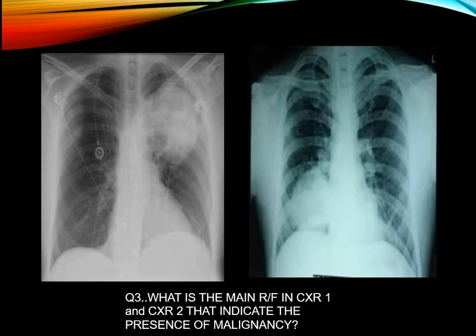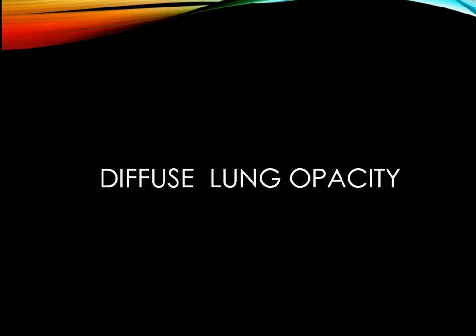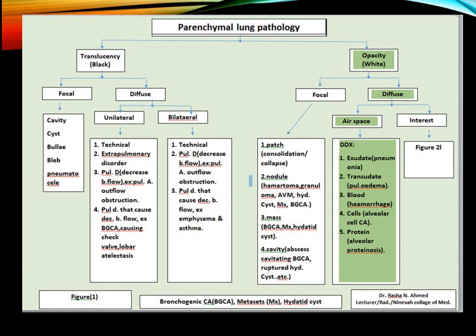The X-ray, I think we explained it in the slide, very clear. Diffuse lung opacity. After we finished talking about the focal lung pathology, we are now talking about the diffuse lung opacity.